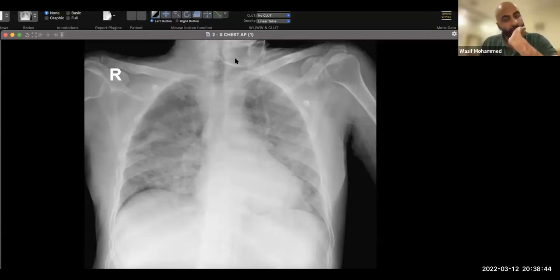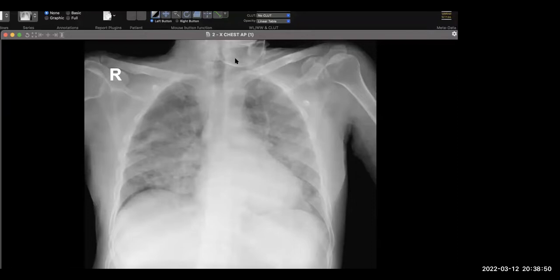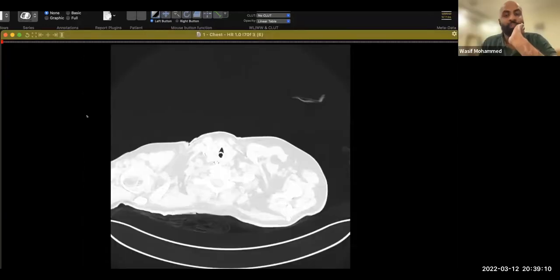The patient presented with acute respiratory distress and he has fever. Since the patient has fever, I would go more along the lines of infection. And with this pattern of central opacification, I would be thinking more along the lines of PCP pneumonia. I would like to know if the patient is immunocompromised. Yes, the patient is immunocompromised.